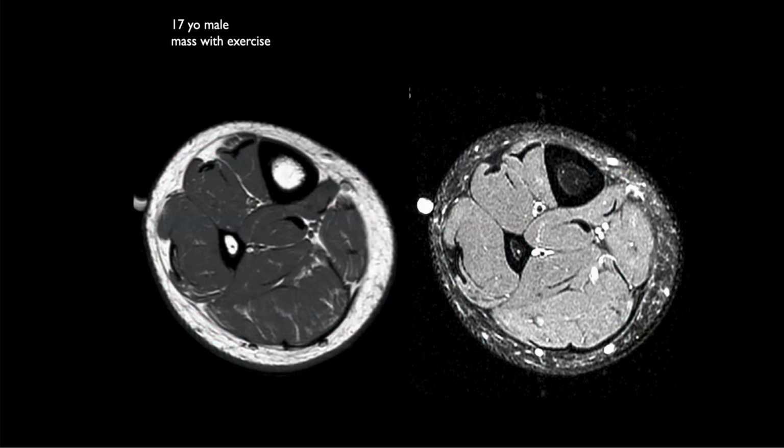Okay, Dan, what do you think of this case? Okay. Looks like there is increased signal of like the vastus lateralis. Oh, this is the wrong area. I'm not sure where you're, I was looking more anterior, up here. Yeah. But yeah, I think the signal's okay. It's a little bit of the shape here. Notice that's where the marker is.